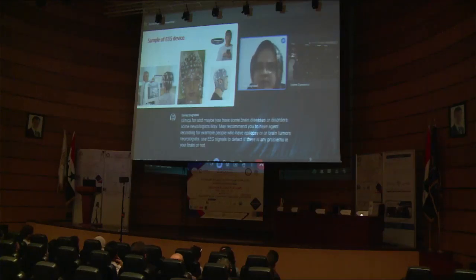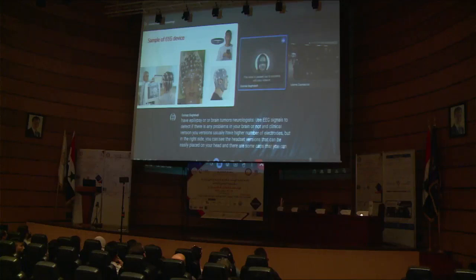Clinical versions usually have a higher number of electrodes, but on the right side you can see the headset versions that can be easily placed on your head, and there are some caps that you can wear easily, and on these caps there are some holes where the operator can easily put the electrodes to start the recording.